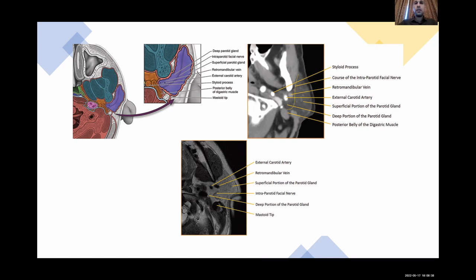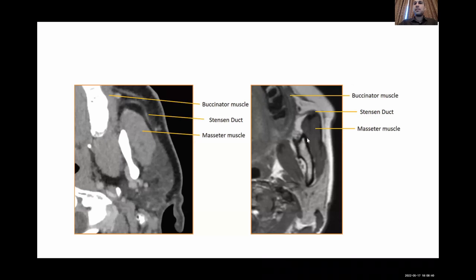Okay, it is the anatomy, the masseter. Going up, outside is the masseter, inside is the temporalis, and here are the pterygoid muscles. Here is the Stensen duct, and sometimes you will find a common variant, an accessory parotid gland, so don't make a big fuss when you find an accessory parotid gland in an MR brain. Just mention it if you like, but don't highlight it.